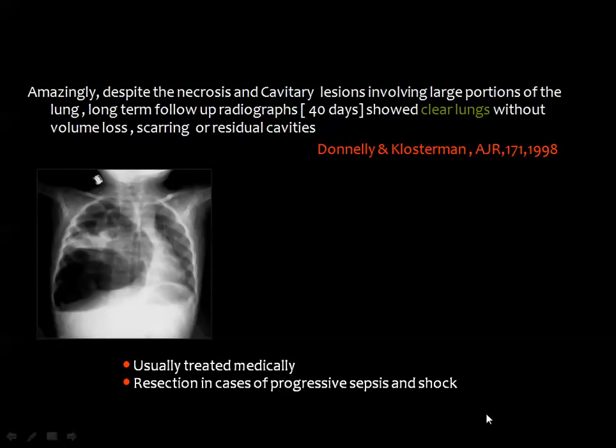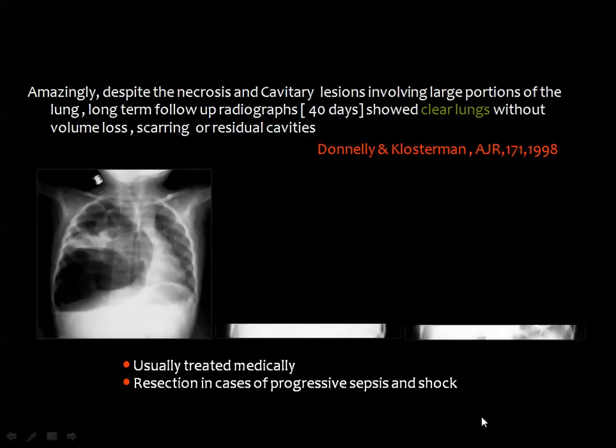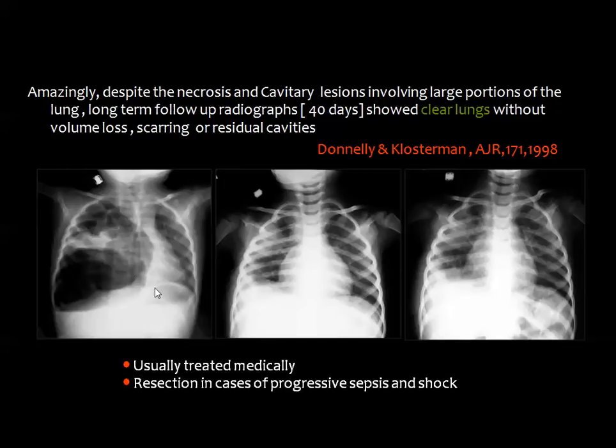Then the follow-up chest X-rays of the same case showed considerable regression of the pathology in the right lung, and the last X-ray showed almost total resolution with regain of the normal appearance of the right lung, in spite of the presence of some pleural collection.